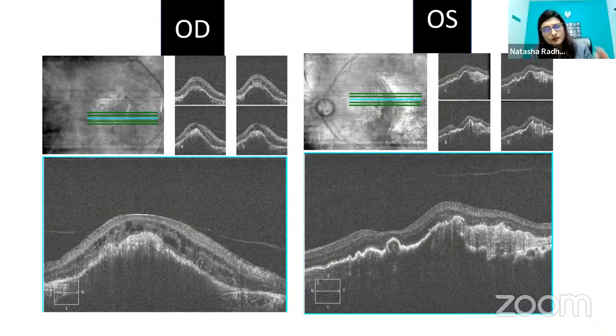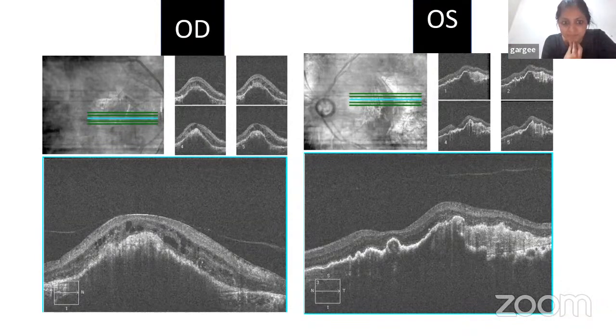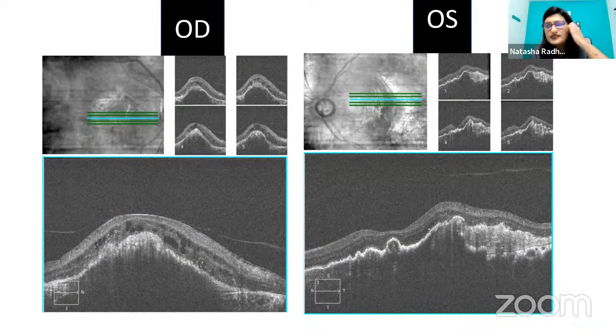What is the overall morphology? Yes, ma'am. The overall morphology of the retina is altered, no? You're getting a convexity there, isn't it? So there is a convexity because the entire retina is elevated under the RPE. So then what else are you seeing in the other eye? So what about primarily, the?